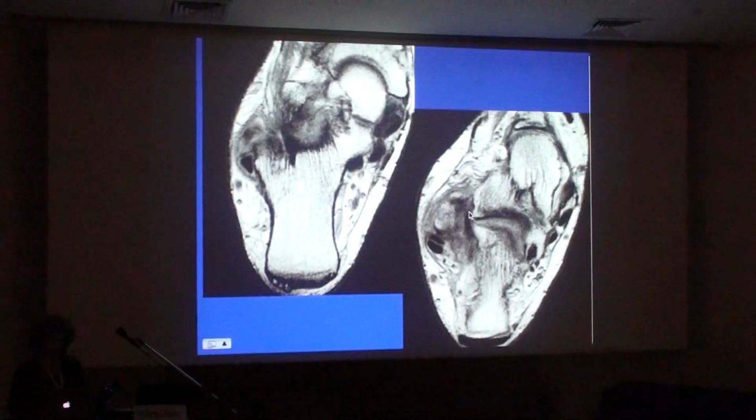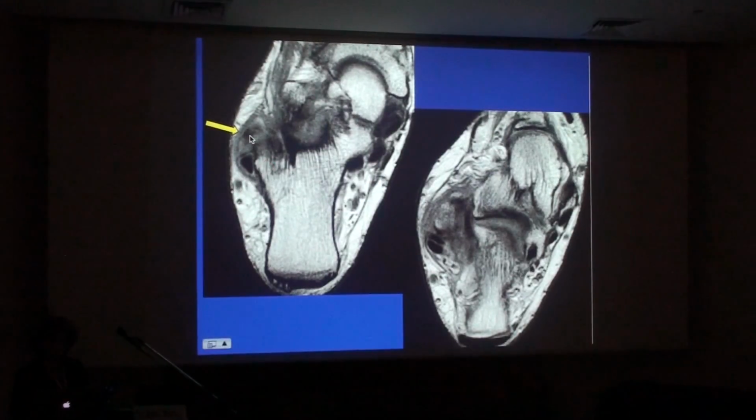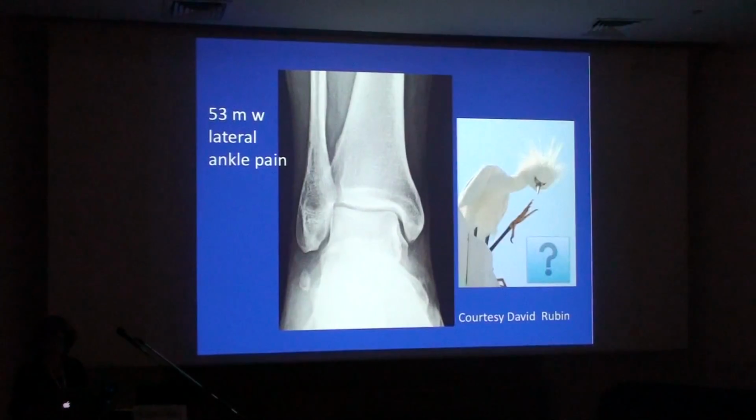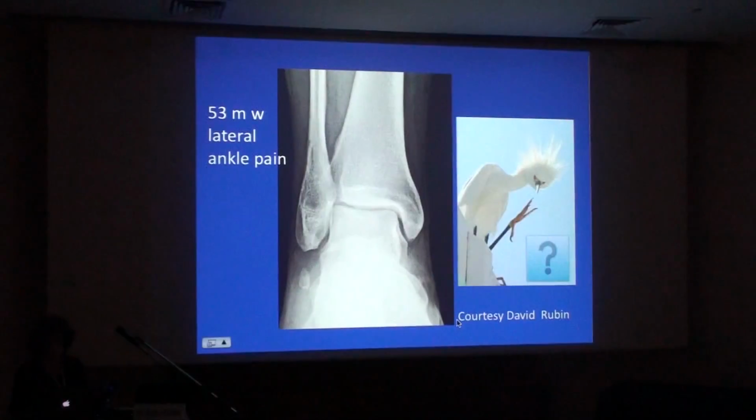Okay, and these are the axial images on it. So here is the big tubercle, here is the markedly torn, inflamed brevis, displaced, torn, I apologize, it's going crazy, and subluxation of the peroneal tendons. They're not posterior to the fibula. I apologize about the animation.